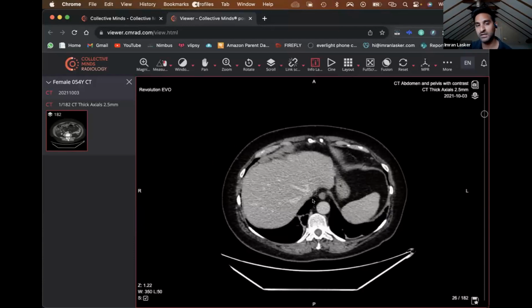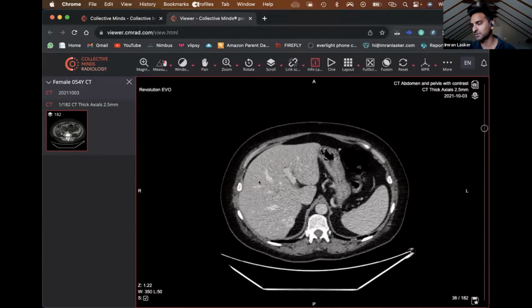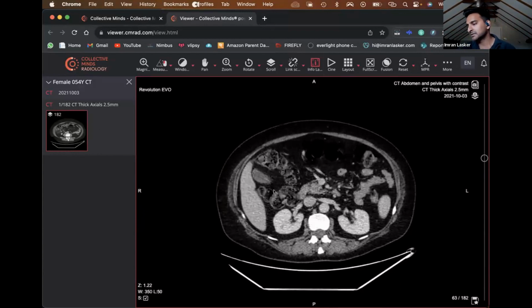You can call them reticulation if you want. Generally speaking, you use reticulation when you get lots of thin bands, and I usually use it if I'm talking about something like interstitial lung disease. But when you get this sort of irregular thin or thick bands sitting around, I just call it thin bands of atelectasis and leave it at that. But maybe that's just a personal preference. Everyone's got their own way of reporting, right? So now let's go from the top.